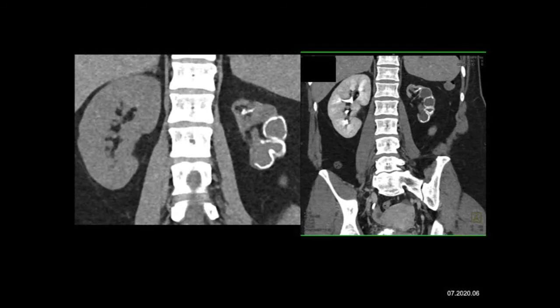You can have calcifications in renal cell, but then the lesions are vascular. This is avascular. Obviously, clear cells are markedly hypervascular, but even papillaries are enhancing up to 90 Hounsfield units. It doesn't have the look of a transitional cell carcinoma either.